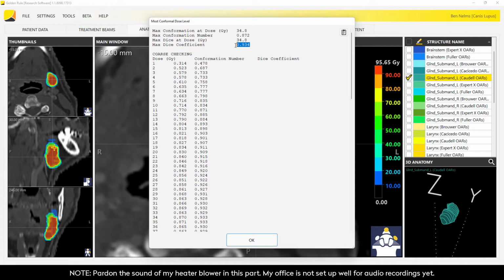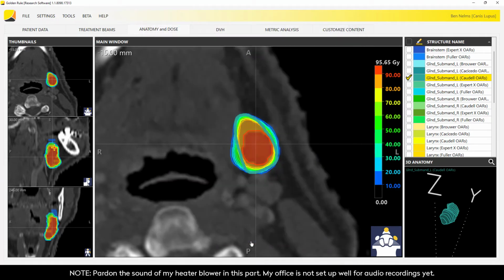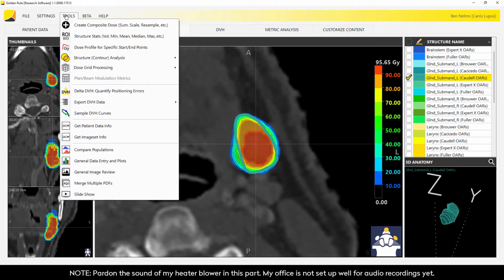So if we look at this, an individual versus a consensus, we saw something similar. High degree of matching for this expert at the 35% level of the consensus. And this is one of the things that might be interesting: can we reproduce an expert when we take the wisdom of the crowd? And if so, then you can start to plan some interesting things with that. Let's look at the volumes.